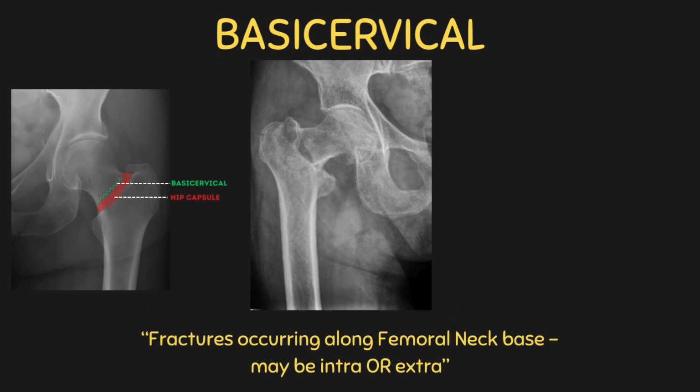Here we have an example of a basi-cervical fracture. Depending on the type of this fracture, these may be intracapsular or extracapsular. These are fractures which occur along the base of the femoral neck.